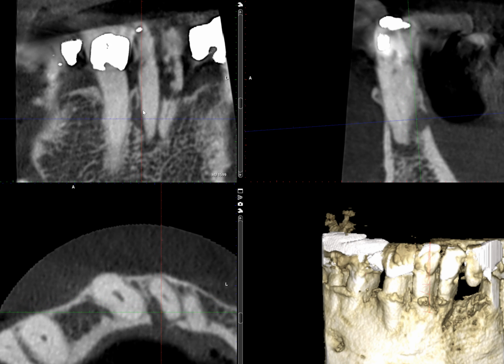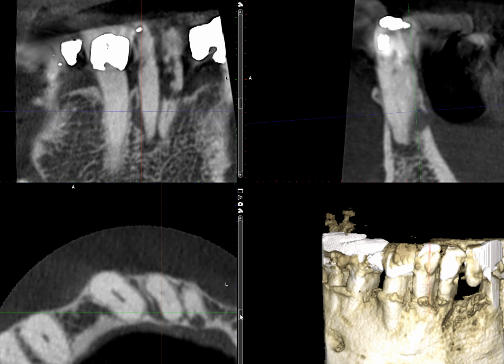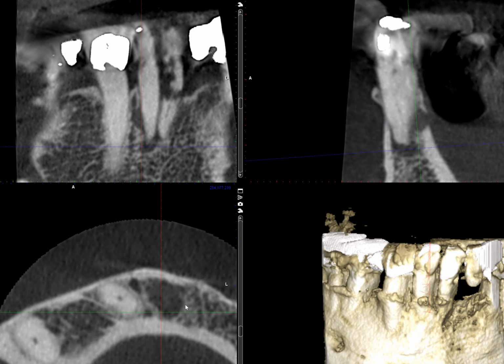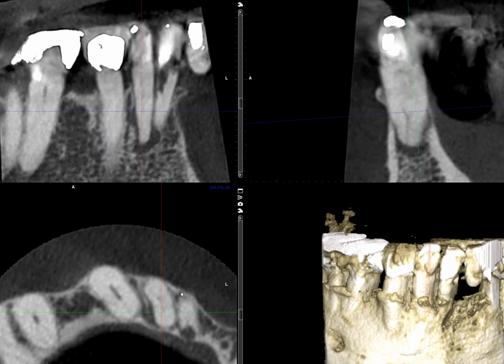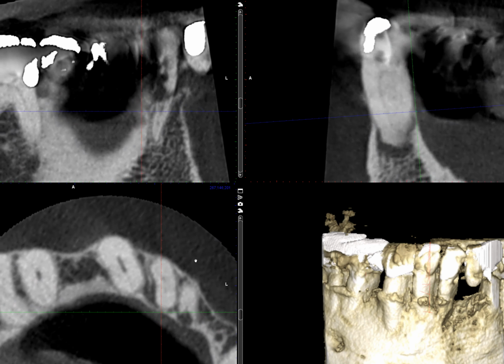Definitely from the first radiograph, we could not visualize this very well. And on the second PA, I think it was a little more noticeable. But again, if you only had a single periapical radiograph, you could have totally missed that. But with three-dimensional imaging, it's very clear that there are two separate radiolucencies. Another thing that you may have noticed is that our student actually successfully found two canals.